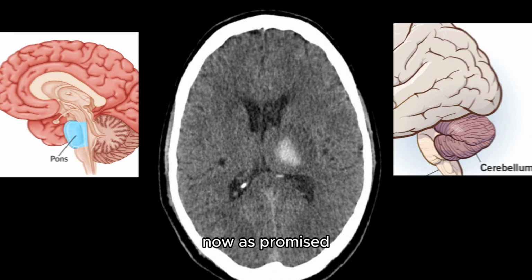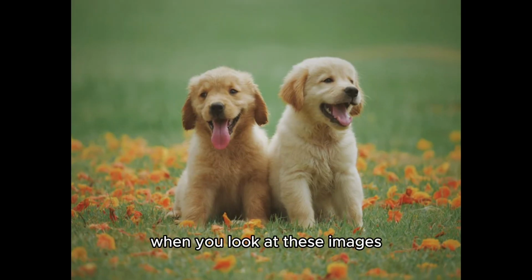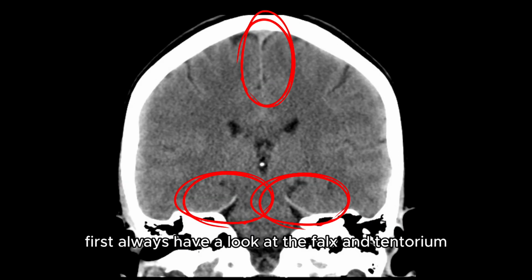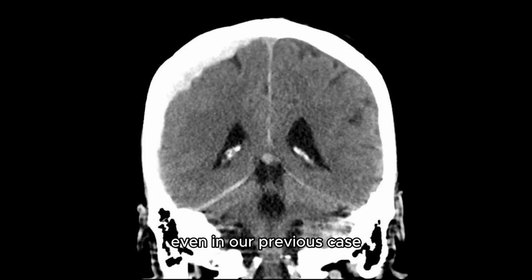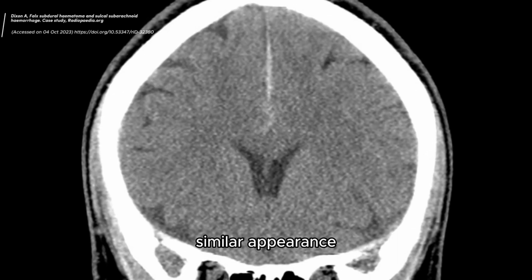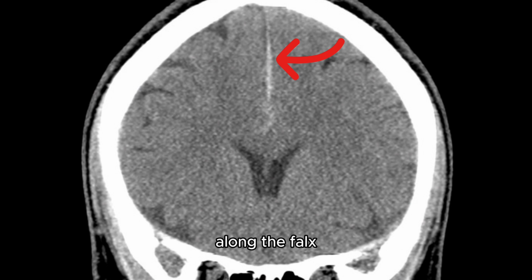Now, as promised, there are 2 tips that I recommend you always keep within your search pattern when you look at these images. First, always have a look at the falx and tentorium to look for a subtle subdural hematoma, as they can occasionally only be seen there. Even in our previous case, we can see a thick tentorium on the right side, which indicates a layer of blood sitting on top of it. Similar appearance can be seen within a localized subdural hematoma along the falx.